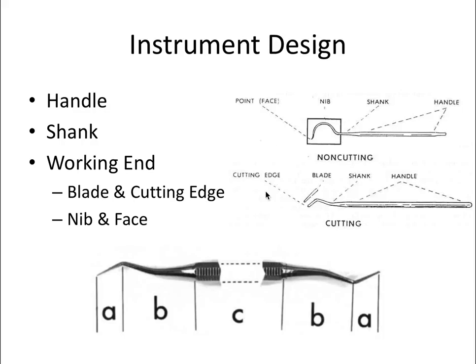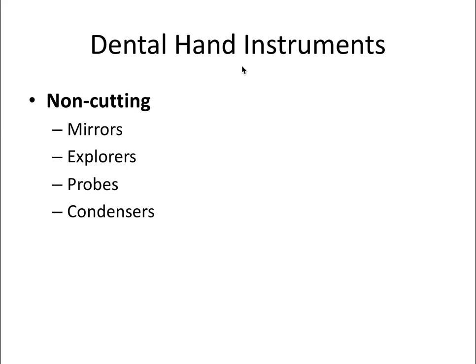So here is another schematic showing the parts and pieces of non-cutting and cutting instruments. So enough about that. Let's go into specific hand instruments, and we'll start with the non-cutting variety.